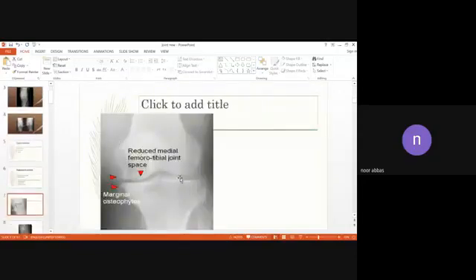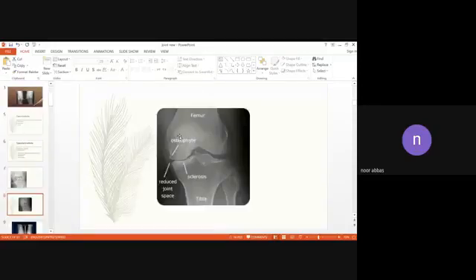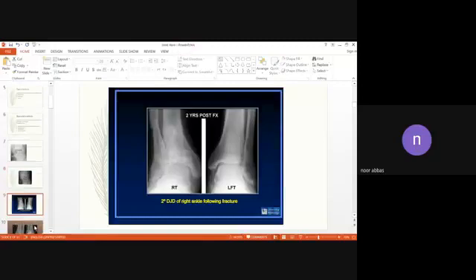This is an example of a knee joint involved by OA, and as you can see here, narrowing is more significant on the medial side than on the lateral side. You have narrowing of the joint space, periarticular mild increase in density with formation of periarticular osteophytes, which are excess bone formation at the margins of the joint. Also another example of OA with periarticular sclerosis evident. لاحظوا فرق بالdensity this side in comparison to this lateral joint space, which is typically spared in osteoarthritis.